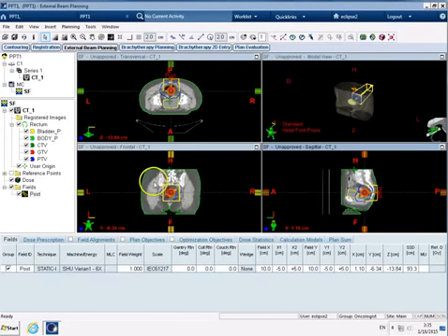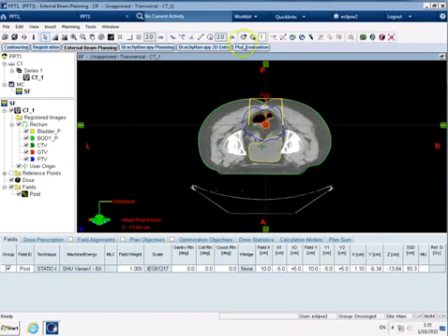And the first thing I need to do is decide where the isocenter is. So just have a quick think for a second or two about where we might want to put the isocenter if we were treating a single field at 100 SSD. So pause the video now and just have a little bit of a think, and then when you've decided, hit play again and see if you think the same thing as me.